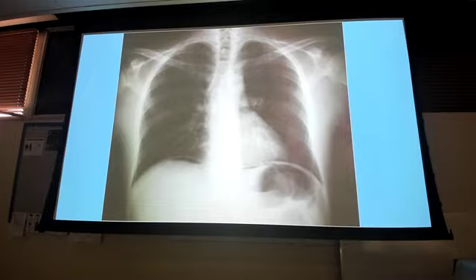So, pneumoperitoneum. There are a couple of ways I can be confident it's peritoneum and not necessarily the mediastinum, right? I don't have my continuous diaphragm sign here, but I definitely have air below the diaphragm on this one. And normally you can't always see it by the stomach, but this one we can see quite nicely, right there behind the heart. So that is a pneumoperitoneum. Why? Probably some kind of perforation. Where? I don't know. In the abdomen. Could be small bowel, could be large bowel. I don't know where.